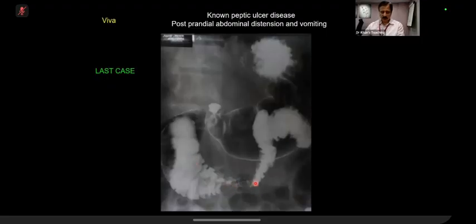If you see here this compression you are talking about, let me give you a hint. Look at the mucosal pattern. It is absolutely normal. Number 2, there is a sort of a band-like filling defect here. Part of the contrast goes distally. There is a bit of transient dilatation also. So with this, what comes to your mind? Webs. Okay. No, I'm not sure that if there is.